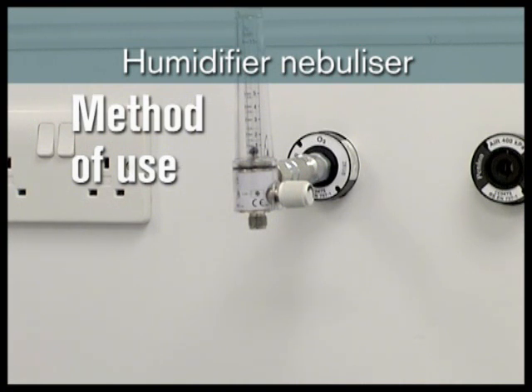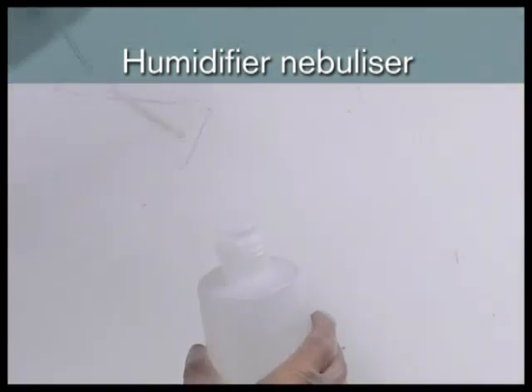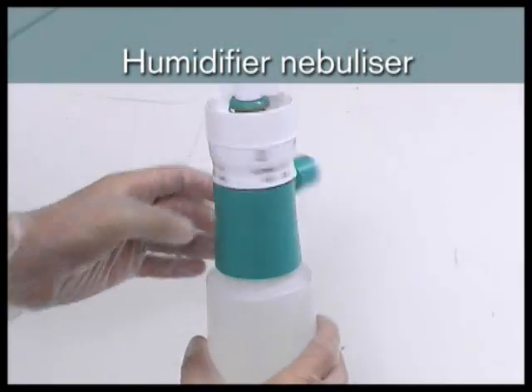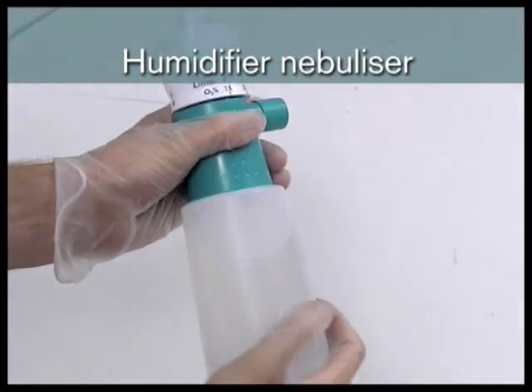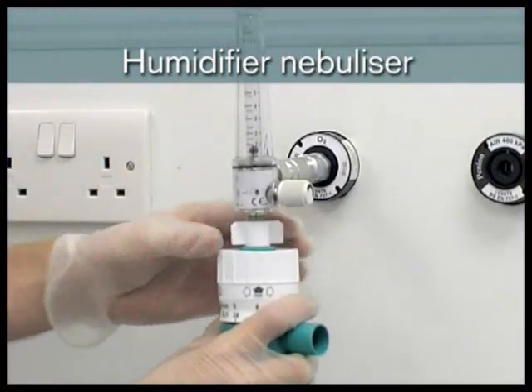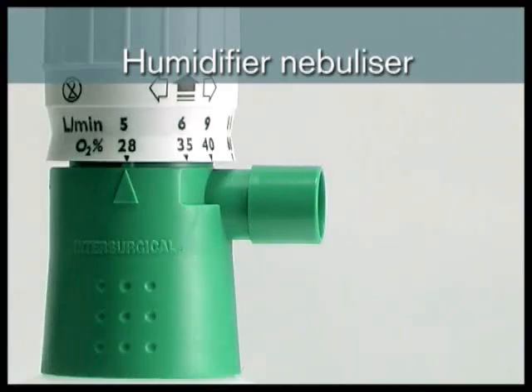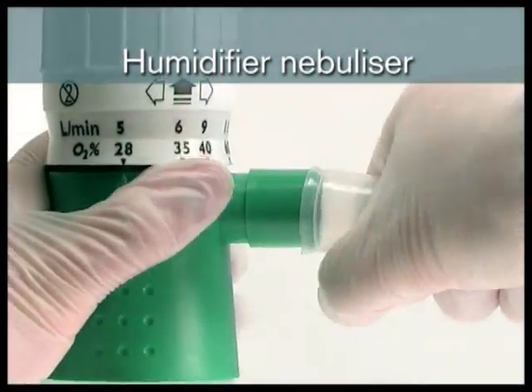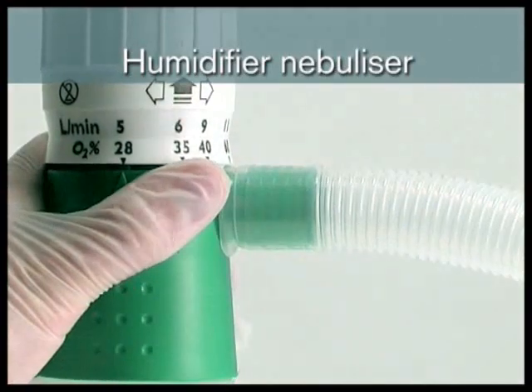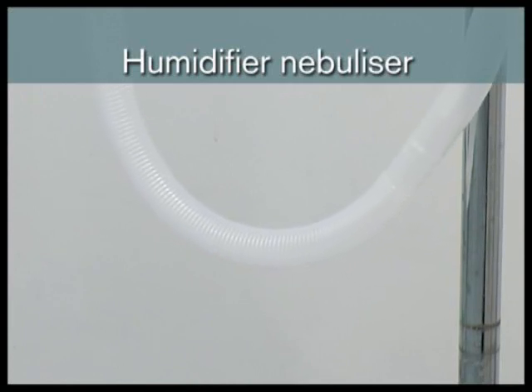The flow meter should be attached to an appropriate oxygen supply. Fill the bottle with sterile water using an aseptic technique and fit to the humidifier head, or fit a pre-filled sterile water bottle. The humidifier nebulizer should then be attached to the flow meter. Attach 22 mm flex tube to the outlet of the humidifier nebulizer. Position the tubing so that the lowest point is below the patient. This is to prevent any condensed water from running into the patient.